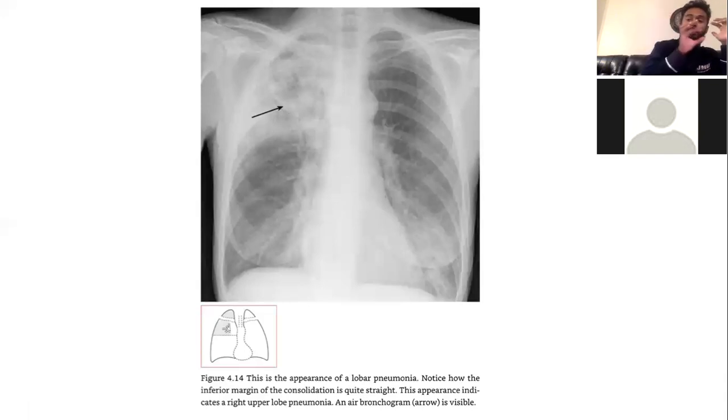Normally, everything is black. The alveoli are black, the respiratory bronchioles black, terminal bronchioles, so everything is black. So normally you don't see anything. Normally you don't even see these respiratory bronchioles and stuff. But now, because the alveoli are consolidated, it gives you this white background where you can see these respiratory bronchioles and terminal bronchioles. So this is called air bronchogram.